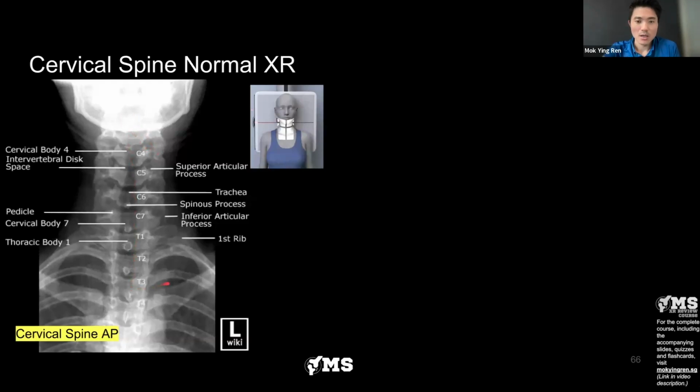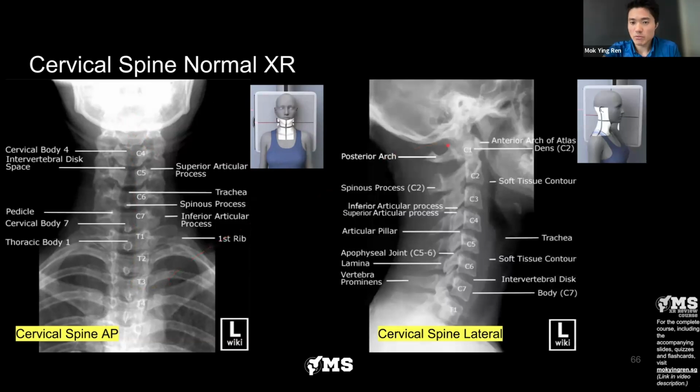Okay, here is a lateral view, and a lateral view is very, very helpful to then count where the level we are talking about. And we usually, by convention, start with C2 because C2 is the largest vertebra. It is also known as the dens, right? It's C2 that I'm highlighting here. Okay, C2 also has a large spinous process.